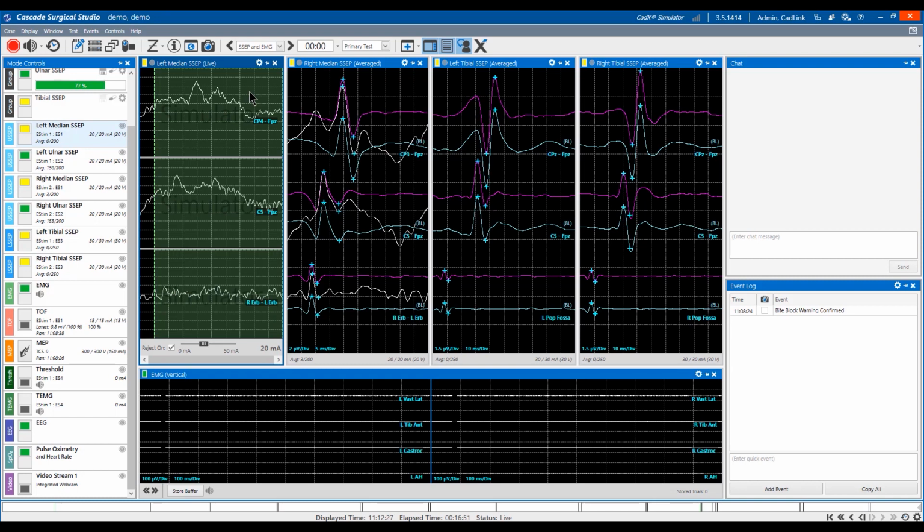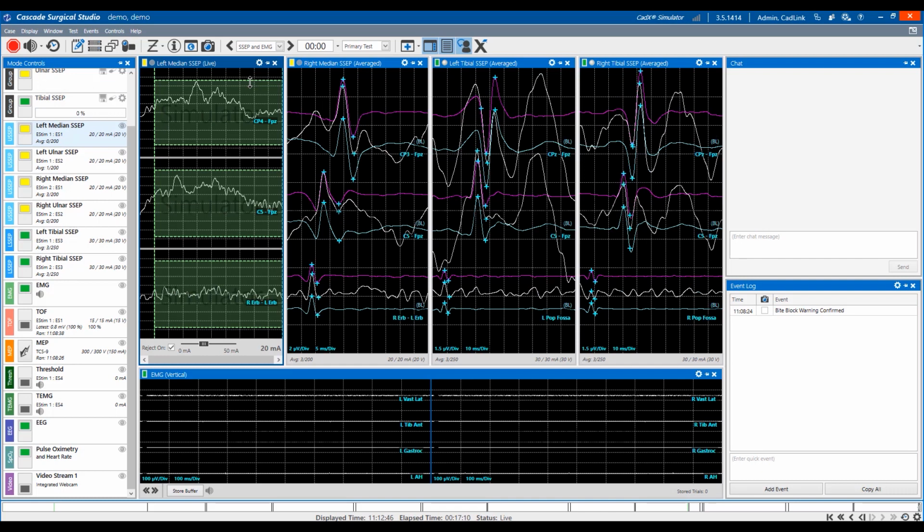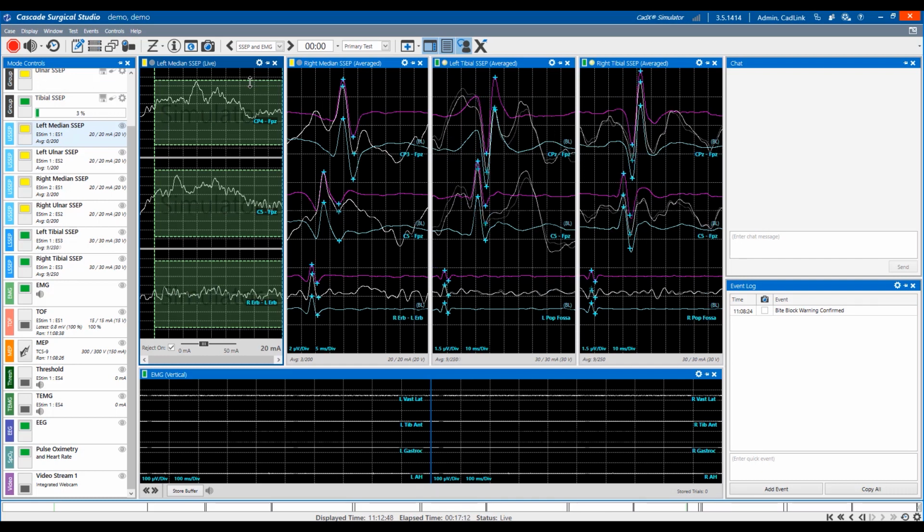The reject windows are limited to each channel's area. The reject area can be adjusted by clicking and dragging the boundaries for all channels together, or holding Shift to adjust one channel individually. The reject windows are now a display option. Showing or hiding reject windows does not toggle reject on and off. That's done in the mode control.